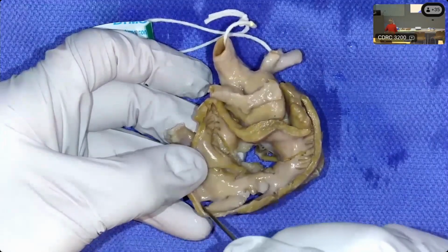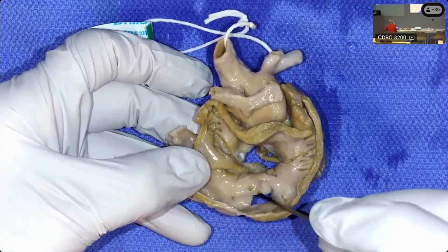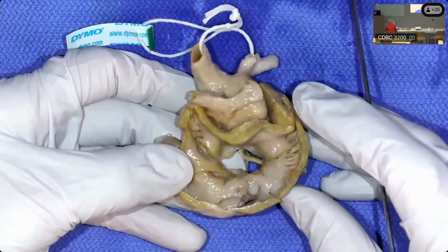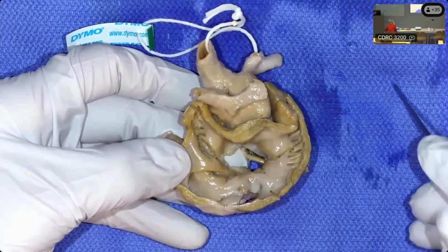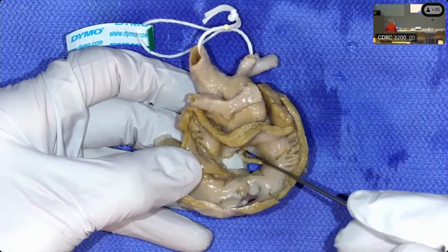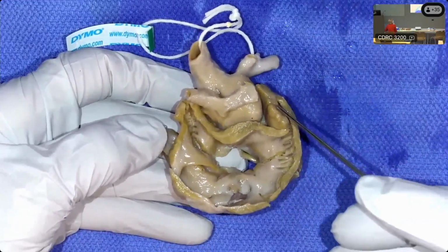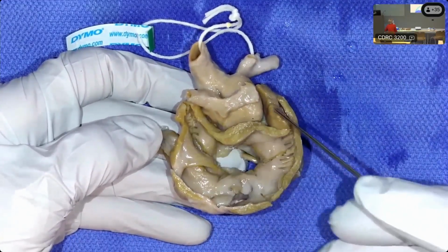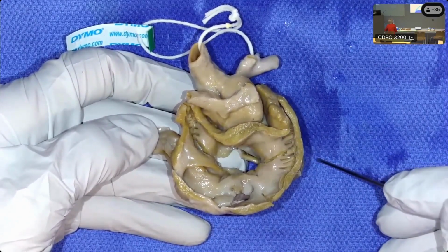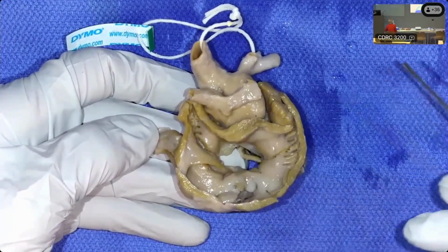Actually, this one looks like it had hepatic veins to the left-sided atrium and an inferior caval vein to the right-sided atrium. So we'll go through the cases that I brought and show you all of the variations that we can see. This one had a common atrioventricular junction, but I brought this short axis just to show you how nice we can see on this echocardiographic view from the base of the heart how we have bilateral morphologically left atrial appendages and a smooth vestibule all the way around.